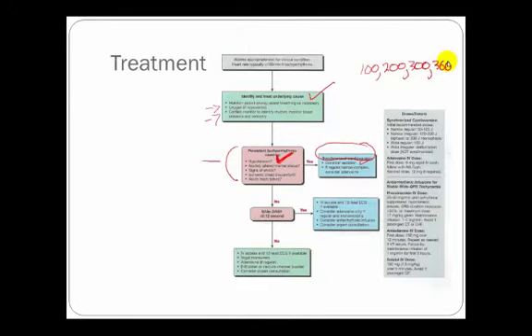Now, some things I need to tell you about here. The sync button needs to be reloaded every time. Whenever you deliver the shock or the cardioversion, be sure to press and hold the delivery button. The reason being is because whenever you have the sync button on, it will wait until the next R wave falls.